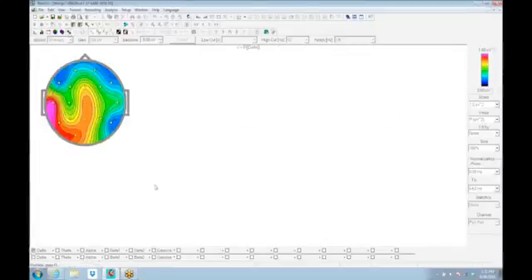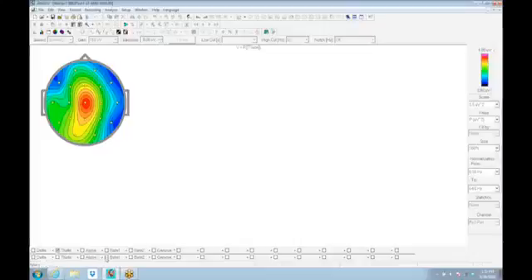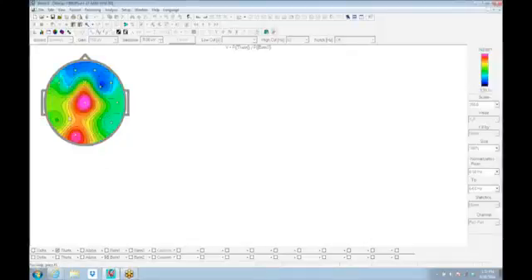Let's say we were interested in the theta-beta ratio. This is a map of, when I select, this is the formula. Now at the bottom I have the formula: theta above the line, beta below the line, is theta divided by beta. So the theta-beta ratio, if I get this to purple up a little bit, is 200%, which is 2 to 1. And a ratio of 2 to 1 isn't a terribly high theta-beta ratio.